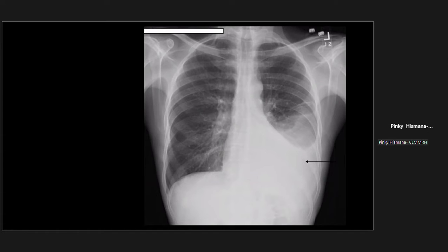In your clinical practice, how would you know if it's pneumonia? How would you know if it's pleural effusion? Actually, if it's pleural effusion, it's more homogeneous and quite white as compared to pneumonia. Then on top of that, it's more confluent. And this one is a giveaway, the meniscus forming.